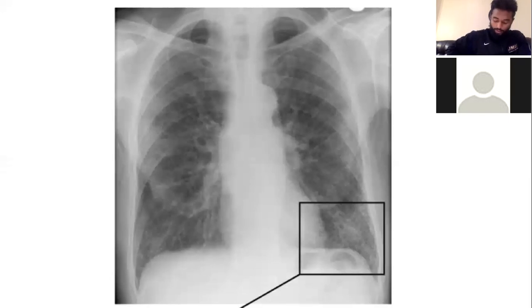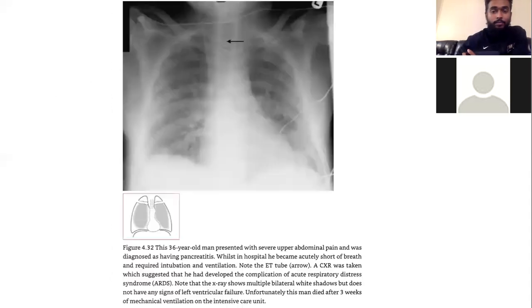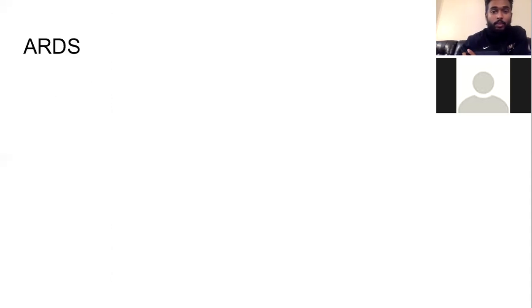Are they less distinct? What's that? I don't know the technical term, but it's much clearer right above the clavicle. Oh, the clavicle right here? Is that associated with fibrosis? I don't know, I'm just wondering. That's a good point. I saw that and I was like, what is that? Everywhere else I see that staticky sign, but there it's clear.